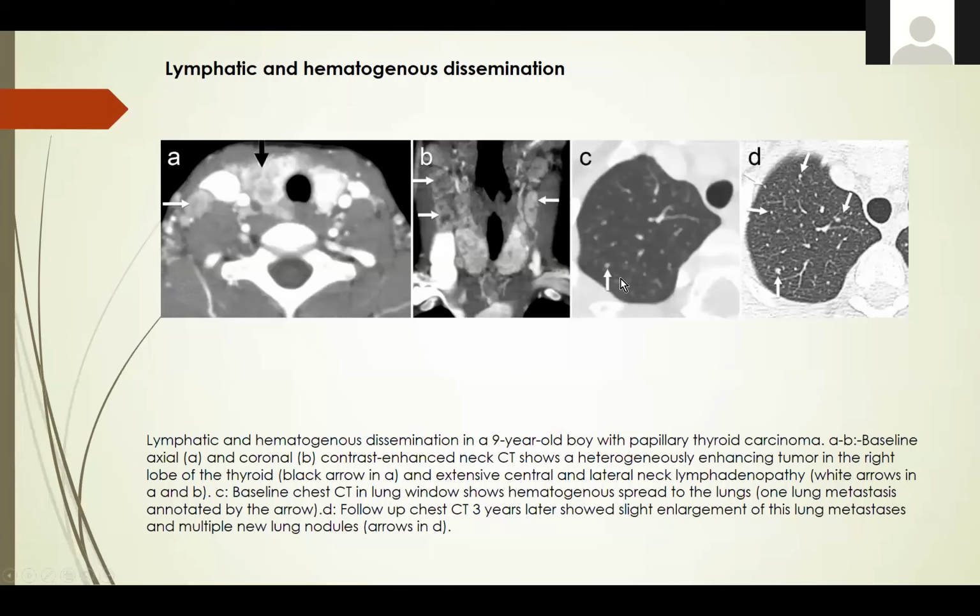Sometimes when we see tiny nodules, we keep questioning, is this tumor or not? When you know that these can drain, we have to follow them carefully. It may not be possible to characterize them on the first study, but looking for them carefully, pointing them out, and following them on follow-up studies will help. This is one nodule seen at diagnosis, and 3 years later, this tumor spreads very slowly, these nodules have increased very slowly in size over a period of 3 years.